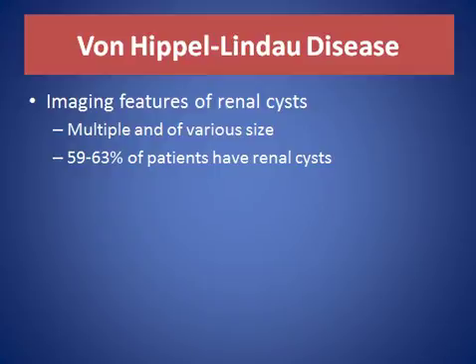Von Hippel-Lindau disease, imaging features of renal cysts: multiple and variable in size. About 60% of patients have renal cysts.